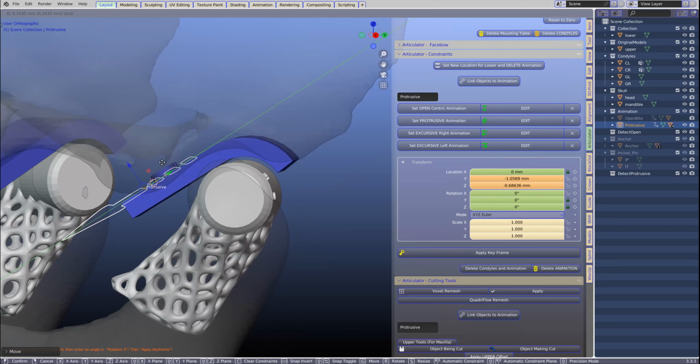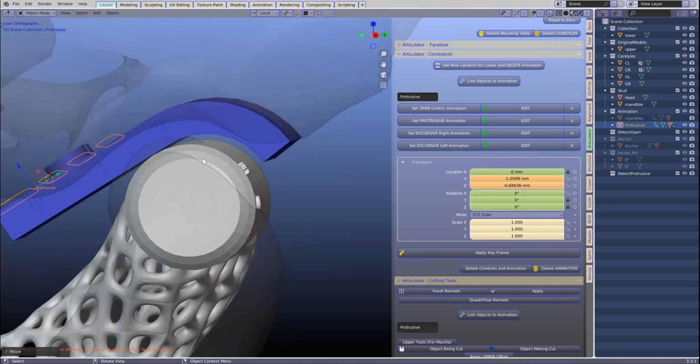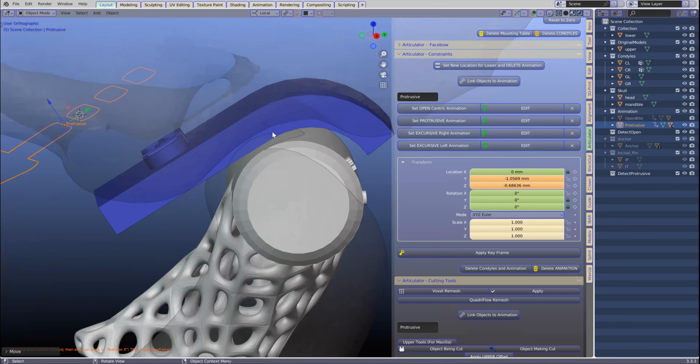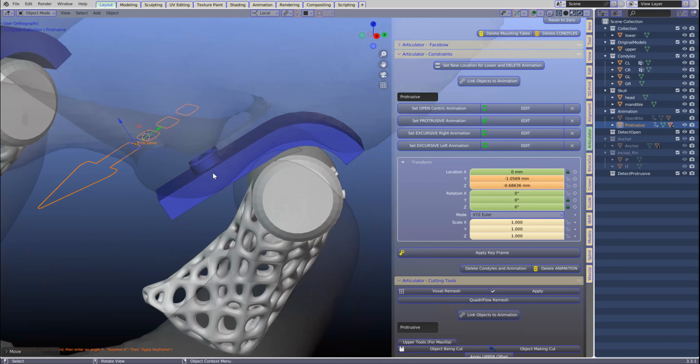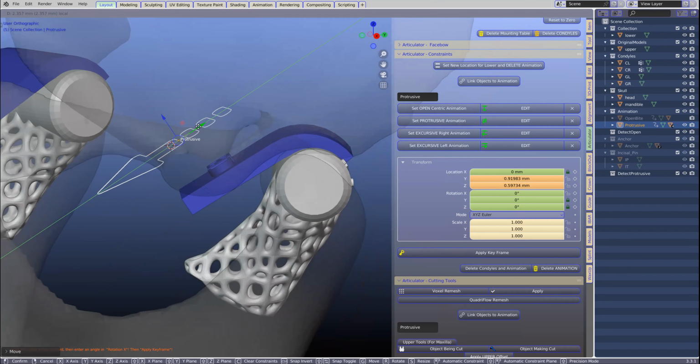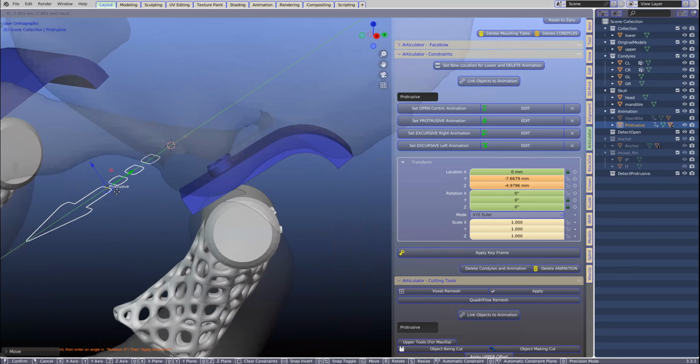Maybe I should put that in for you, because we haven't had a need for that. Can you see here? It says 0, we've got 5 and we've got 10. Perhaps I should put in smaller increments. I haven't had this request before, because now what we're moving is the jaw from here.